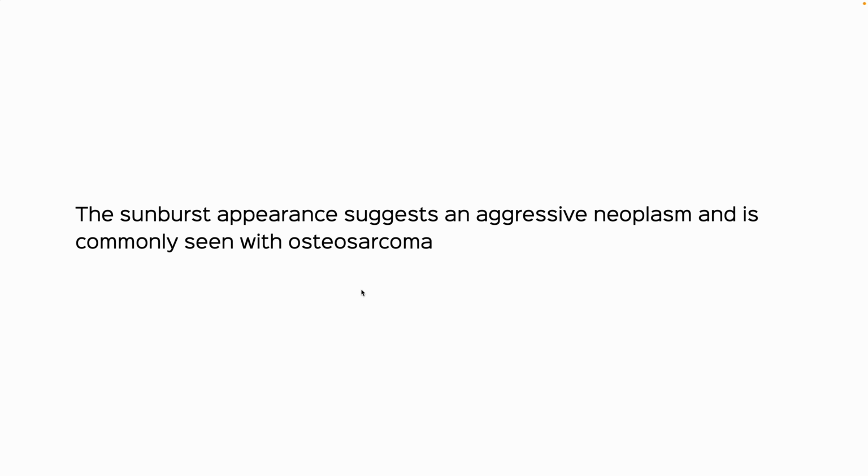So the sunburst appearance suggests an aggressive neoplasm. It is commonly seen with osteosarcoma, though it can be seen with other tumors. Not very commonly seen these days because tumors are often picked up much earlier, but when you see it, it's reasonably classic.